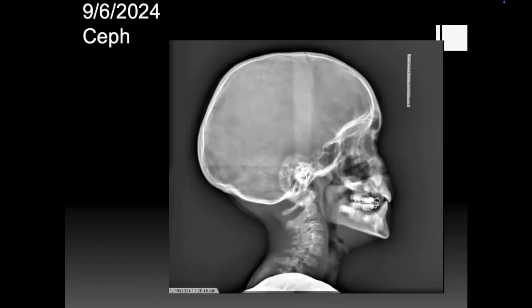And a Ceph without a nose. Yeah, so we'll have to... We've gone through this a lot with the radiology department. So if they do that, just make them fix it. Yeah. But what do we glean from here?